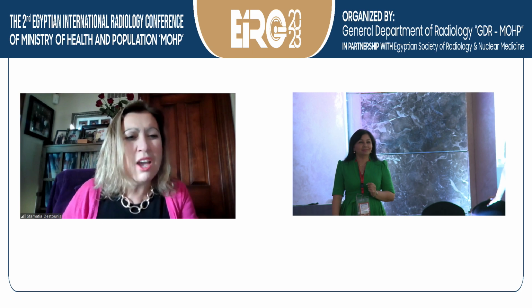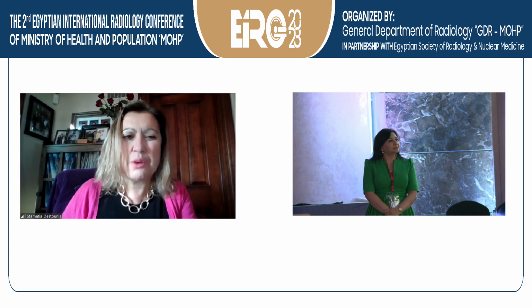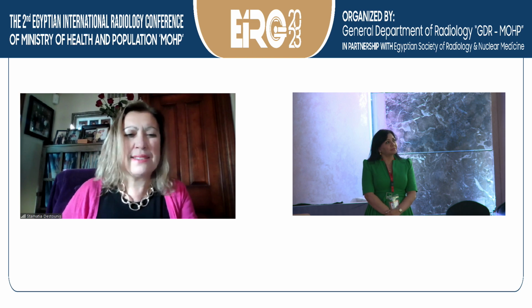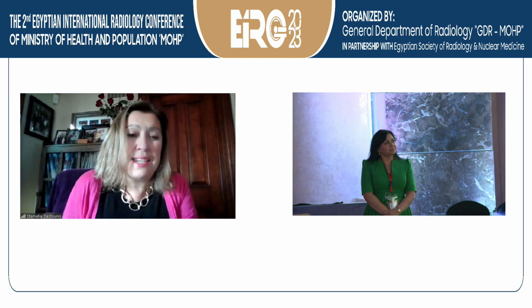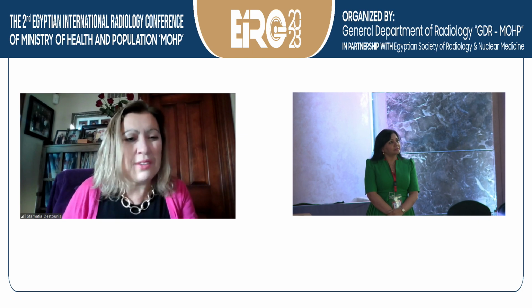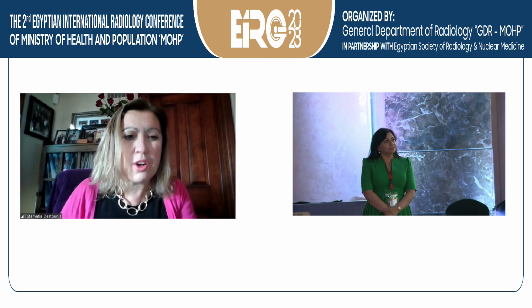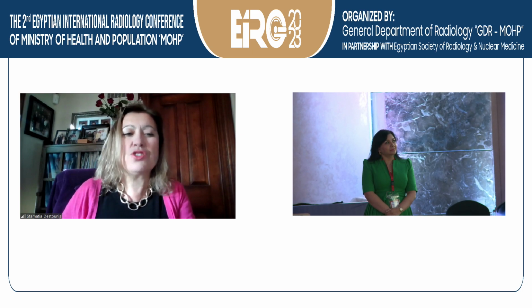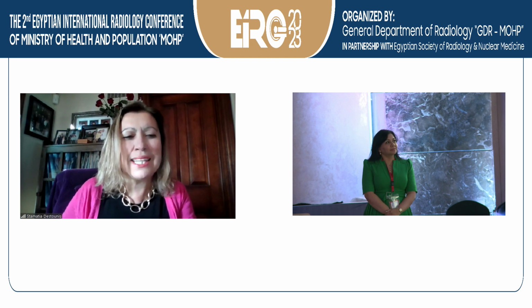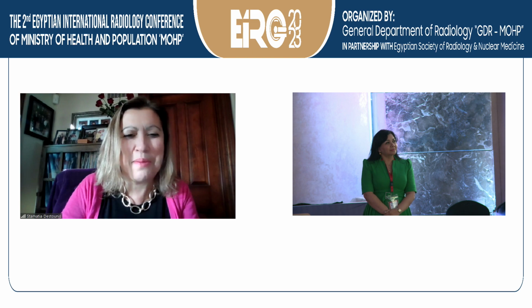And with the high resolution contrast imaging that we have now with MRI, if you see something that looks significant, even if it's very small, and you can see margins, and it's a mass, go ahead and call it that. If there are multiple different areas that look very similar, obviously you probably will discount it, especially if you have prior MRI. We're not really asking you to change your practice. It's just really not use focus for every single thing we don't know what to do about.